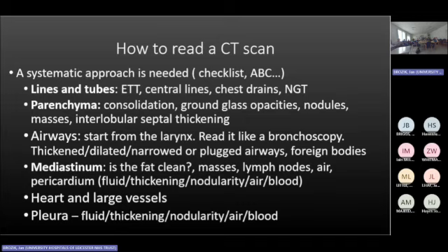The same thing can be happening, for example, in the SVC. So we are injecting into the right arm. So from the right brachiocephalic vein, we're getting contrast blood, and from the other side, from the left brachiocephalic vein, you're getting non-contrast blood. And is it a clot? No, it's just non-contrast blood.